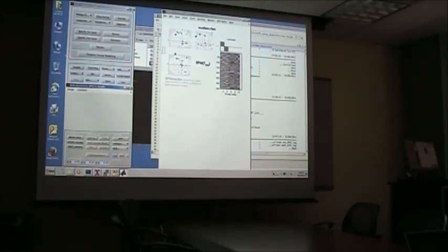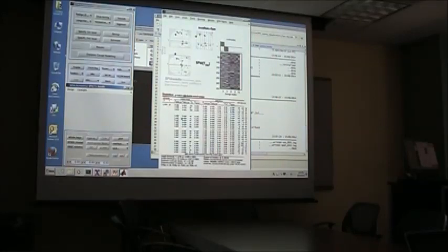In any case, once you run this model, SPM has a couple of buttons that give you a table of activation, which is often something you want. It's a little messy maybe in the beginning, but you get the coordinates of all the regions that showed activation. You also get statistics, which corresponds to what I talked about before: cluster level and peak level, or voxel level, statistics.